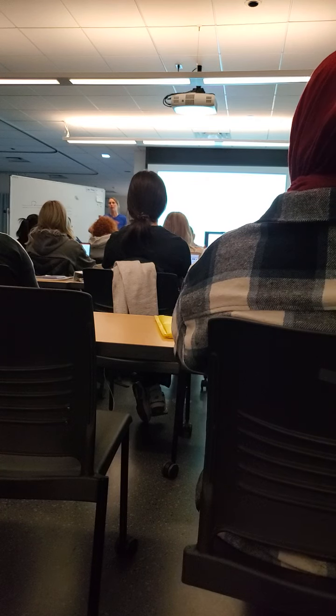The one thing we do want to make sure of is that if they're over 1 centimeter, they're not an actual mass. So they're typically smaller than a centimeter. But as we get larger than that in size, we're like, hey, wait a minute, is this an adenoma, which we'll talk about in a minute? Is it carcinoma? Or is it an actual polyp? So as these things get bigger, we get a little bit more suspicious about them. As they get bigger too, you might see that they have a little root or a feeder stalk of vascularity.